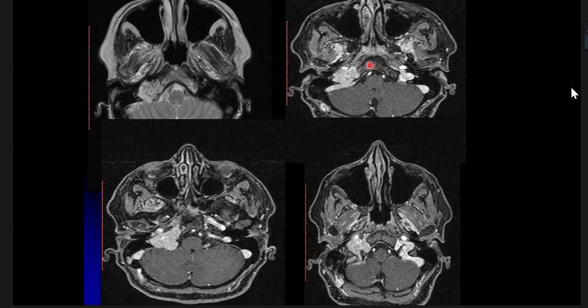Third important is how the lesion extends. Surrounding sclerosis will be there, sir. Bony sclerosis, okay, not destruction. Does the bone density is maintained or reduced, or it is maintained, but there could be a permeative destruction or sclerosis only? Sir, in the region of CP angle, CP angle meningioma, like I am asking about jugular foramen only.